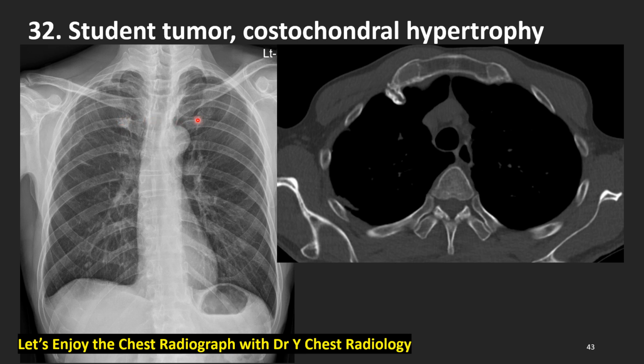But on the left side, it's not like that. This right side is more hypertrophied than the left side. Sometimes this mimics a lung nodule, lung cancer.